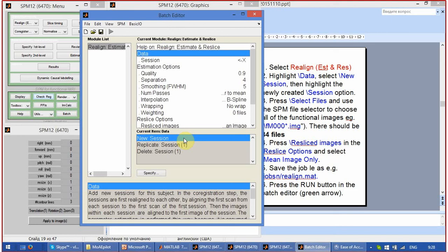That's why the software will reorient slightly all the 84 or whatever is the number of scans so that they fit precisely each other, and it will generate the data array of the motion parameters. This is what you are going to see at the end of this module.